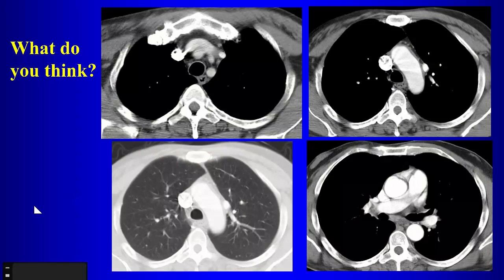All right. So there's an abnormal vessel illustrated here. Which image shows you? Do you see where the vessel is? Very persistent. So right here, this guy over here. Right? You shouldn't have a vessel like that sitting in front of the aorta. Right? So the question is, what is that?